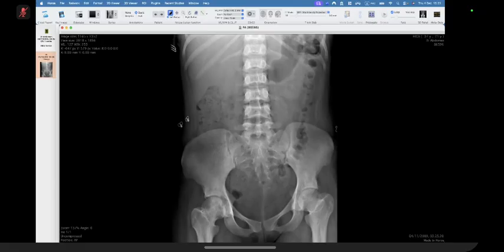So I would like to give the differentials on the findings of this patchy sclerosis of the right femoral head. I would like to know the history of the patient. If the patient is young and having right-sided hip pain, this can be early stage right femoral AVN, where I cannot appreciate significant osteoarthritis at the moment, but some patchy sclerosis and lucencies are there.